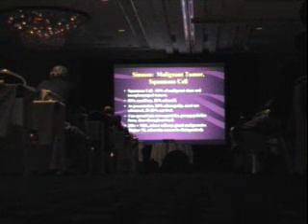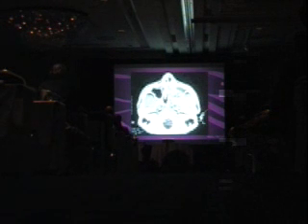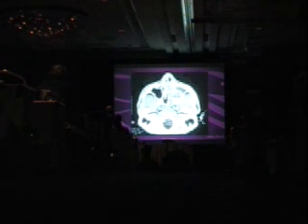Antrochoanal polyps may be indistinguishable from inverted papillomas. So again, if you see the soft tissue mass going through the bone, destroying the bone on either side, that's probably tumor. But tumor, again, is very, very rare in the sinuses. Basically, most of the time when you do see it, it is a squamous cell carcinoma. On the other hand, this can easily be an antrochoanal polyp, but if it's an isolated mass in the maxillary sinus coming up into the nasal cavity, think inverted papilloma, especially if there's no other sinus disease.